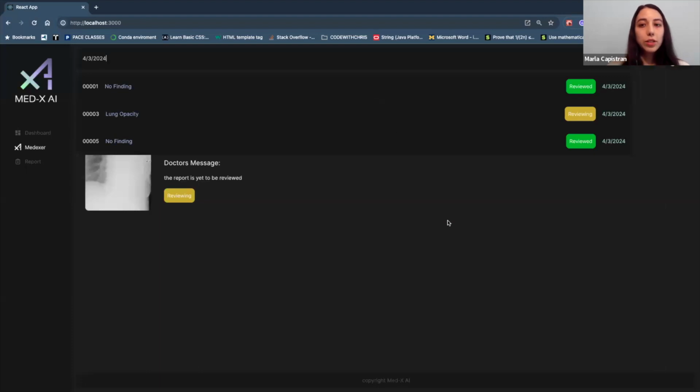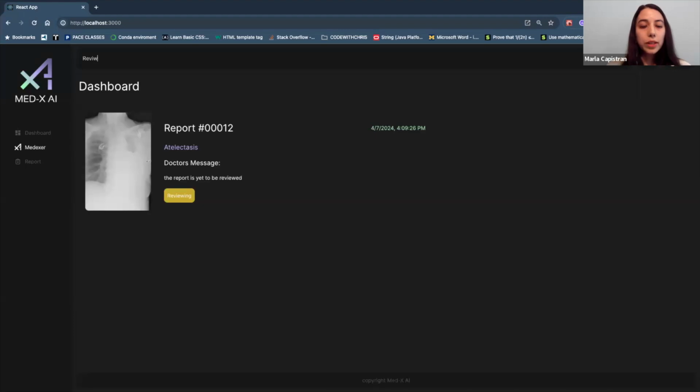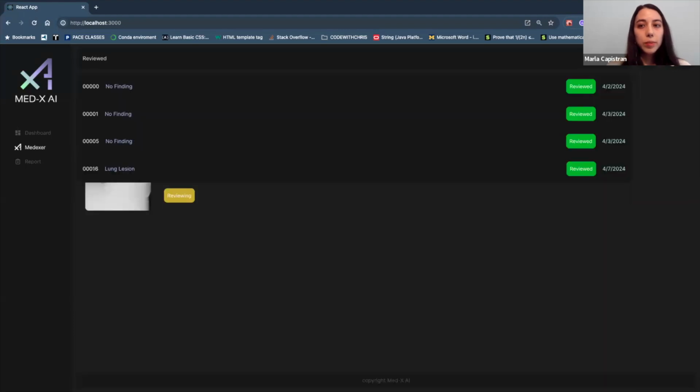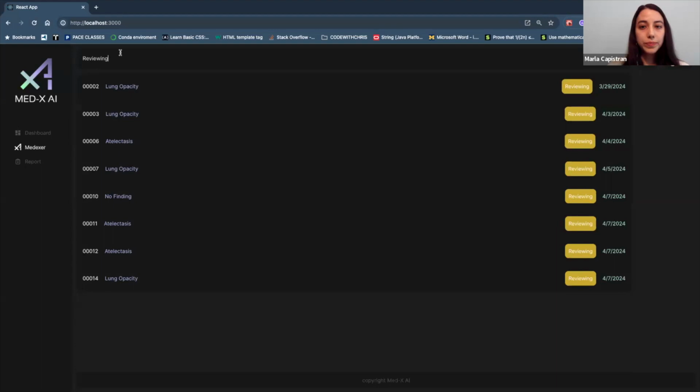Furthermore, Angela can use the search bar to look up reports reviewed and validated by doctors. When she types reviewed in the search bar, it lists all the reports that have been reviewed. When she types reviewing, it lists all the reports that need validation by a doctor.